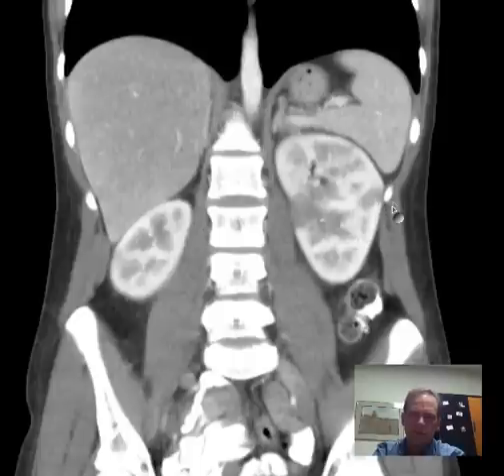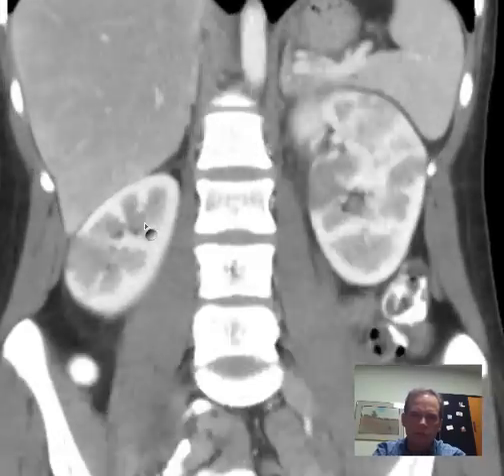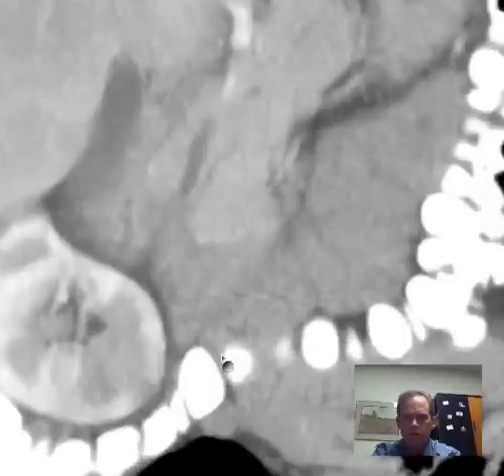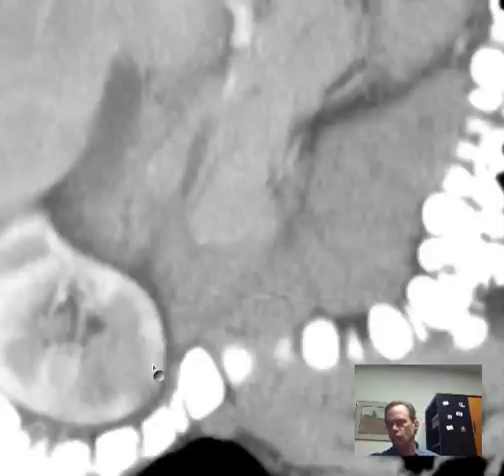and if you see a case and you just see a little something like here, that one little area of abnormality there, or something very subtle on one or both sides, and you're afraid to say, hey, could this be that? Like this right here, for example. That right here, see if I can sell this to you. This is a diagnosis, right here. Nothing else. You see this, unless it's an older person with old ragtag kind of kidneys, and this is not that kind of patient.